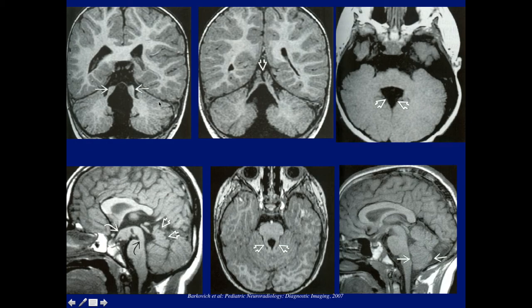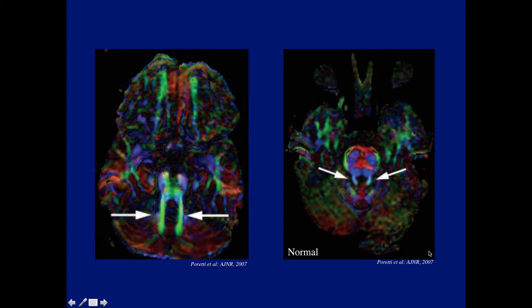Here's another patient showing hypoplastic vermis, the superior cerebellar peduncles, and the narrow isthmus, and all the changes in the cerebellum. Sometimes the tonsil may be enlarged. And of course, modern neuroradiology shows this anomaly again. Here's a case from the literature showing the enlarged AP and PA directed green superior cerebellar peduncles compared to the normal size.